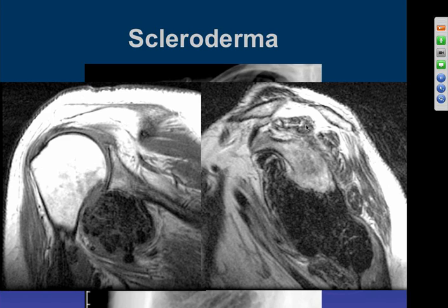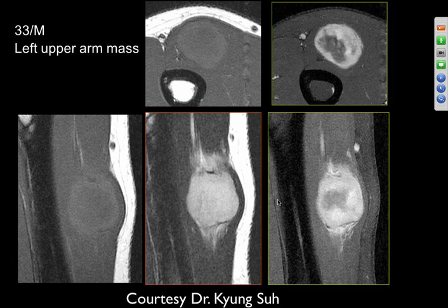Notice how much atrophy you have of the other rotator cuff muscles, and all this calcification and a kind of hypertrophy of the subscapularis that's involved, probably from chronic inflammation. Philip.